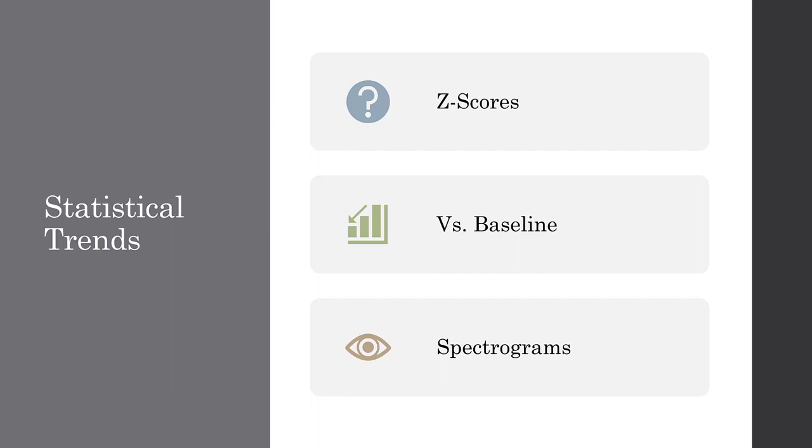patient states and then checking that parameter over time might be done. For example, recording alpha delta ratios for a patient state and then manually comparing them using a statistical measure at periodic intervals every several hours or so. You could do that.